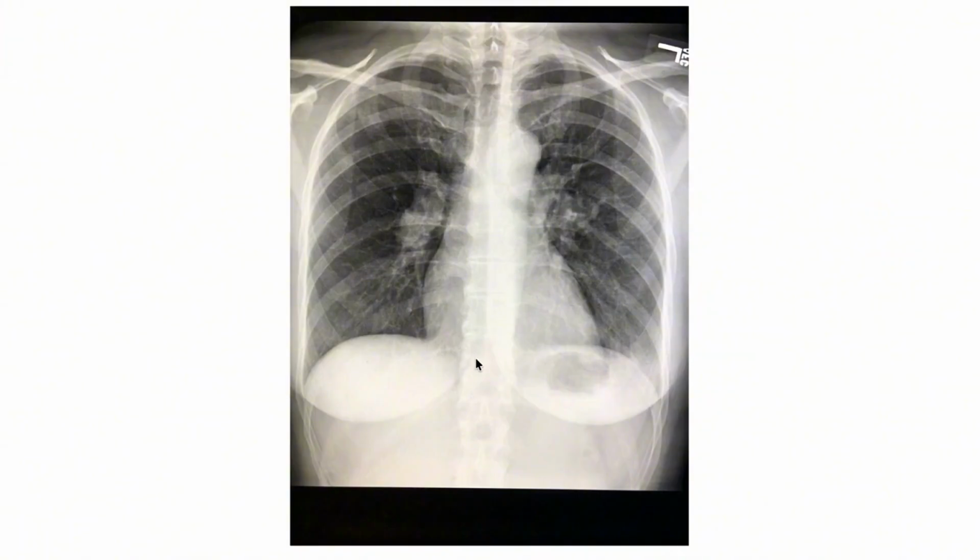Right here on the screen, it's usually advised that you systematically look at the different aspects of this chest. That will give you the information. So you systematically look at each and every aspect of this chest, just like a checklist. You tick it and say this is okay. But when you are writing a report, I wouldn't like a report to be written in that form.